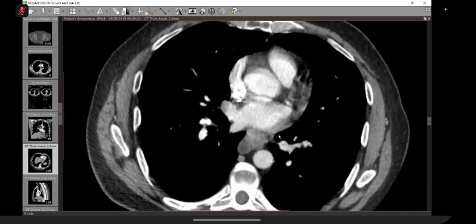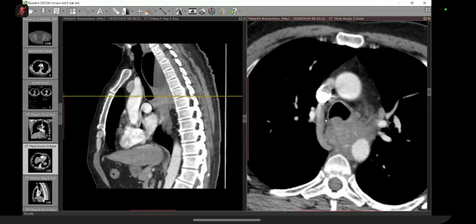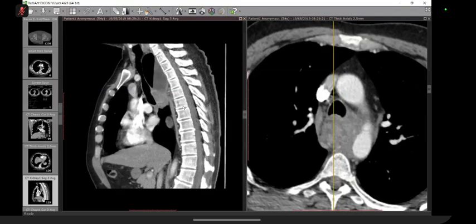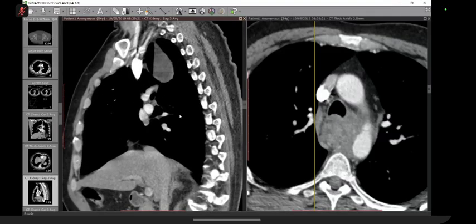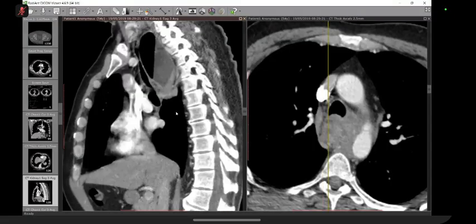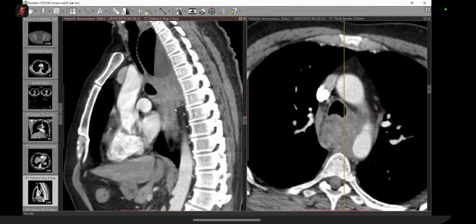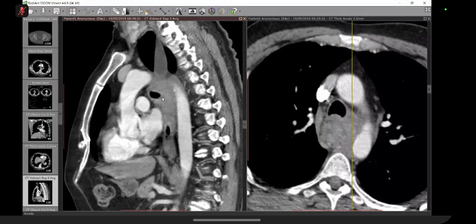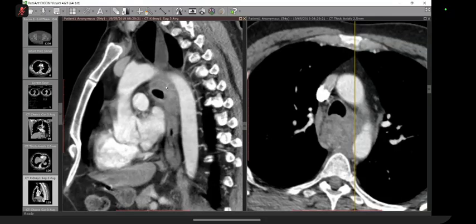When in doubt, for a left main bronchus, another technique which we do is that we go for a sagittal. Now, if you see here, just concentrate on the trachea, and I am coming to the left main bronchus. Do you see?